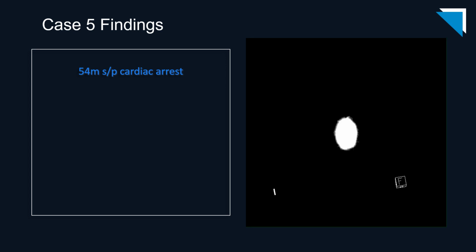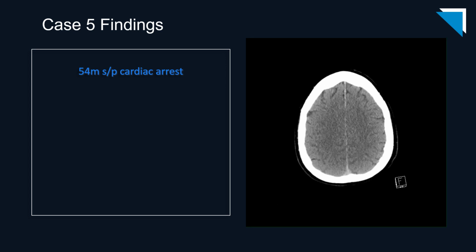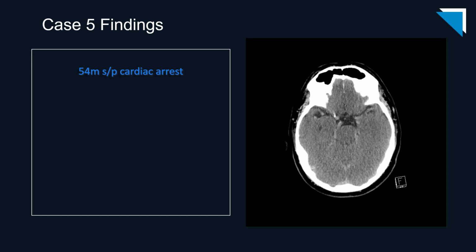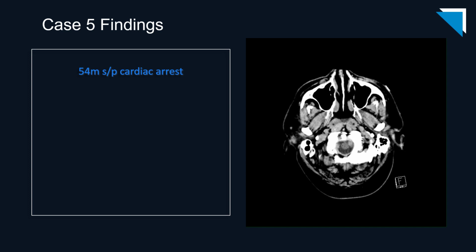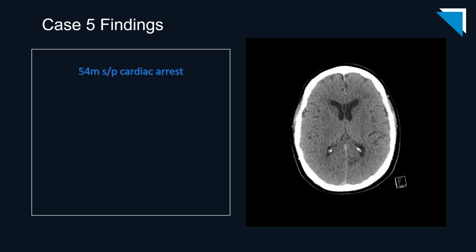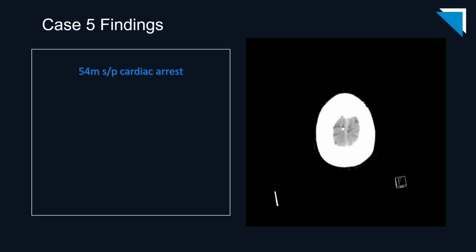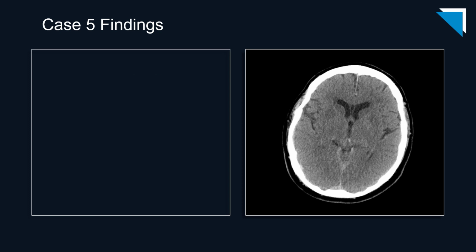Let's review the axial images. No need for the coronals in this case.